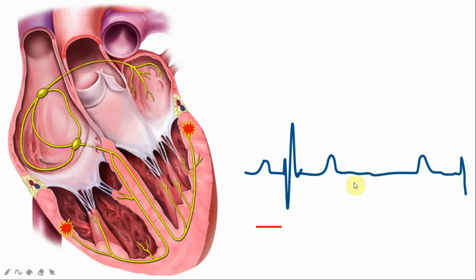In another video, I have shown you what happens in first degree atrioventricular block, when the PR interval prolongation is very high, more than 200 milliseconds. And in another video, we have third degree heart block, where we have shown that the PR interval is not constant, it varies because there is no correlation between the P wave and the QRS complex.